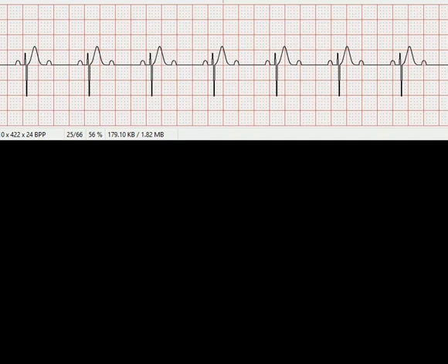All right, I'm going to have you go ahead and walk through this rhythm and pause the video, and then we'll go ahead and analyze it together.